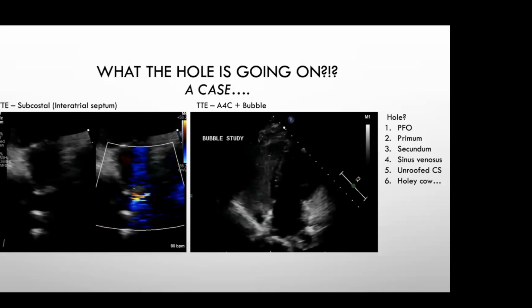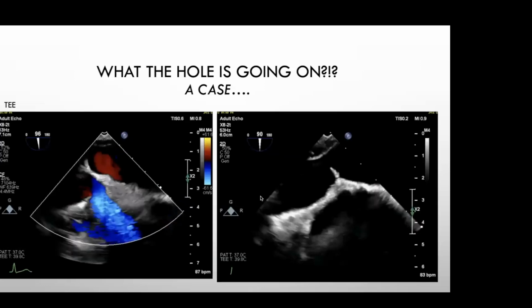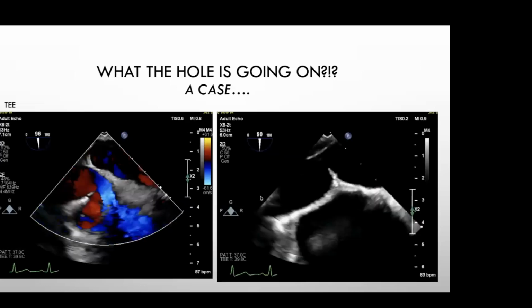So we got a mix of answers. The next pictures are from the TEE. That was actually the first test that was done.